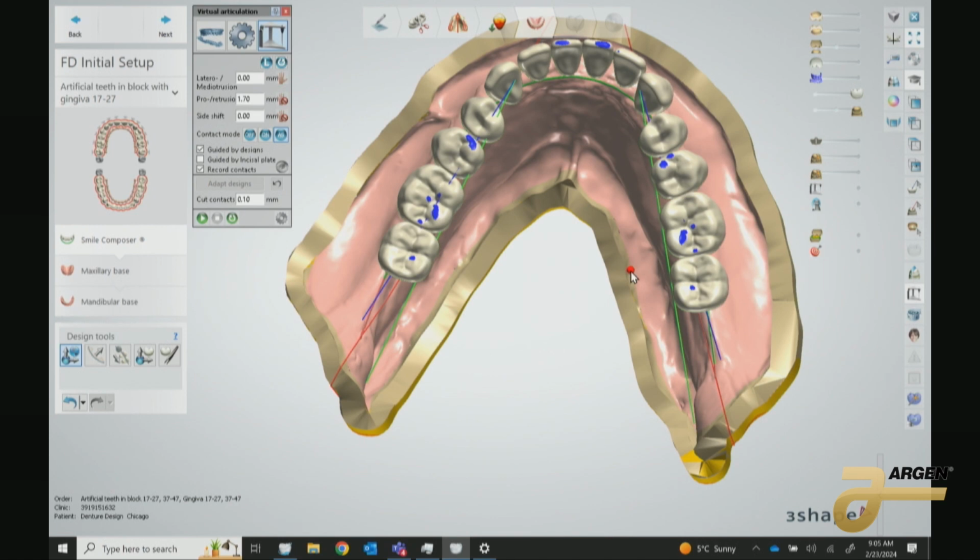The nice thing is, and this kind of goes into occlusal schemes, which again, we don't have time to get into, but a lot of these cases, the anterior posterior is kind of preset for you in this. So if we're making a lot of individual movements, 1 tooth at a time, that's where we're going to wreck this nice setup that's already done for you. So try to make big movements, moving blocks of teeth at a time.